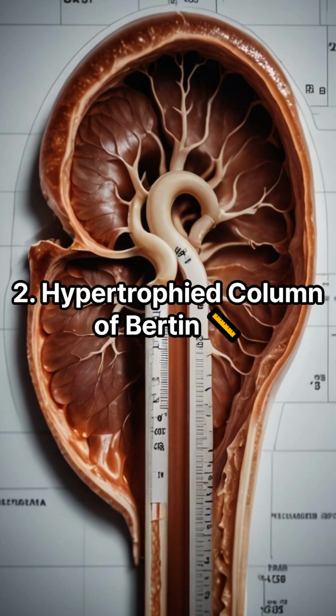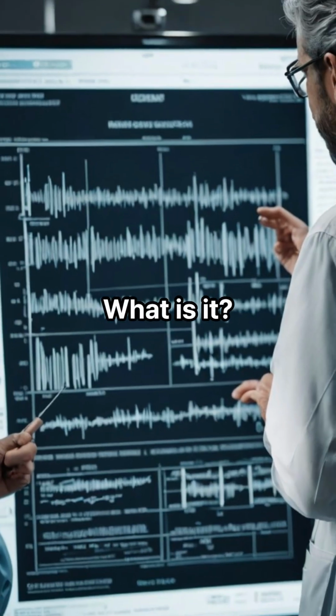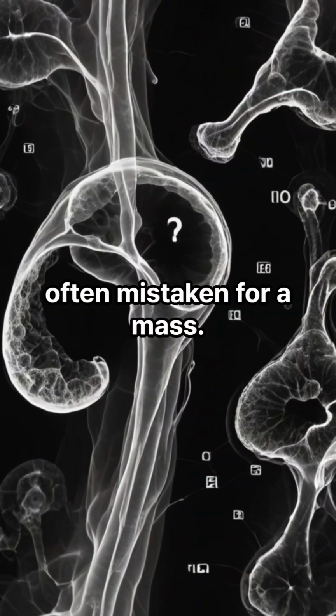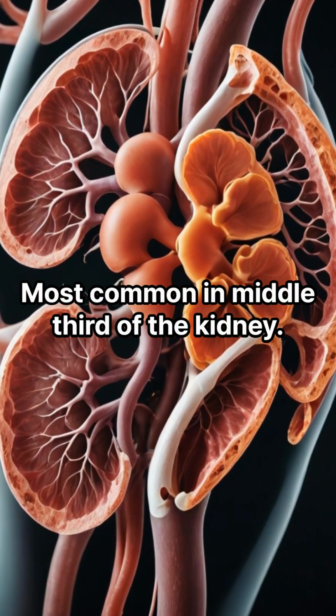2. Hypertrophied column of Bertin. What is it? A normal extension of cortical tissue between renal pyramids, often mistaken for a mass. Most common in the middle third of the kidney.